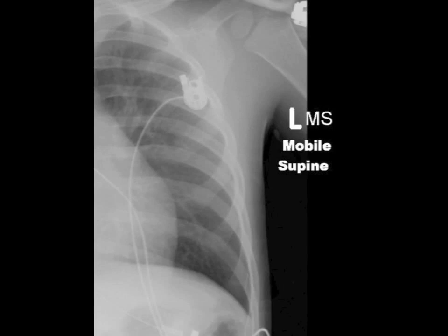Similarly, when an X-ray is taken of the patient in the supine position, the mediastinal structures may appear wider as the structures fall out to the side rather than down due to gravity. Additionally, supine X-rays are taken with the X-ray box closer to the patient, resulting in a greater degree of magnification of the anterior structures.